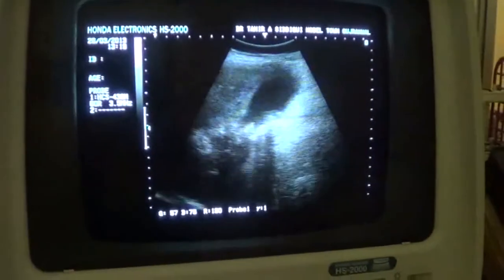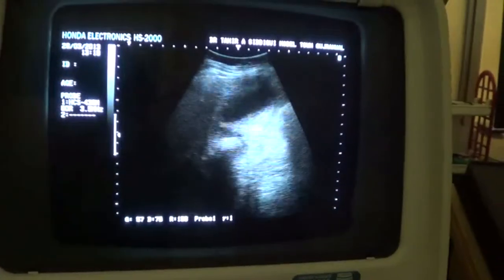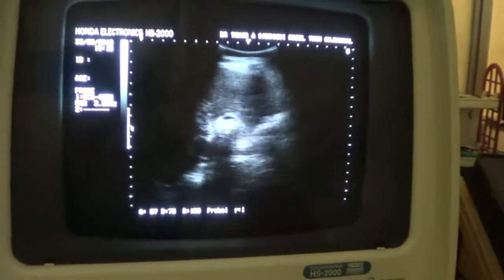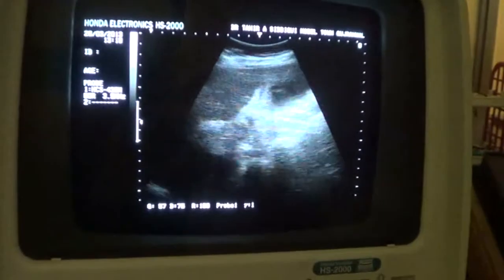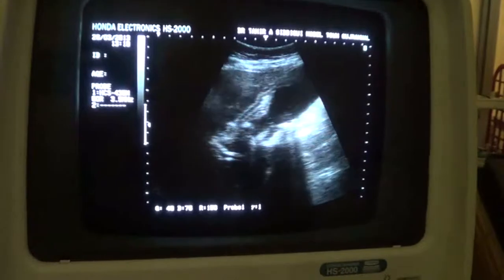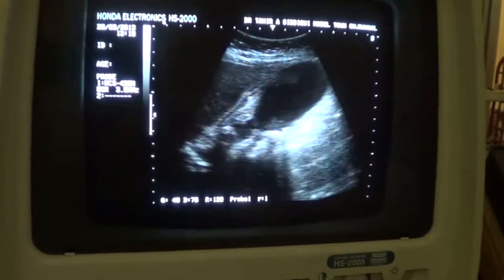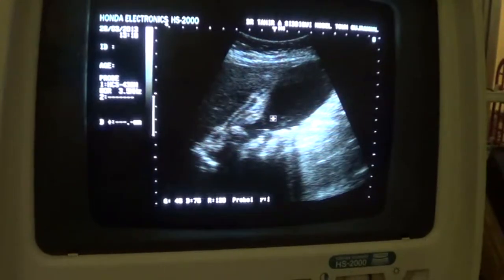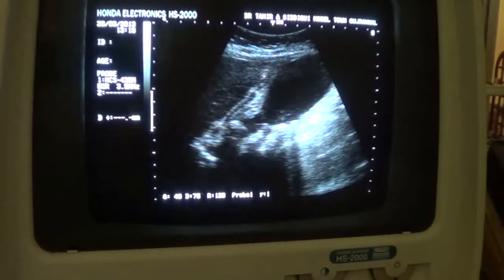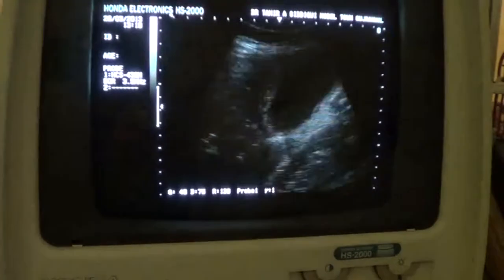you see that the gallbladder is not distended as it is usually seen in case of pancreatic pathology or GB outlet obstruction. So this is the fluid rim around the gallbladder, and these are all calculi within the lumen of the gallbladder.